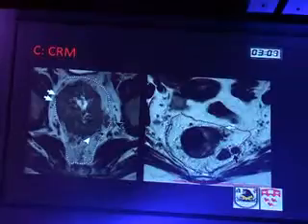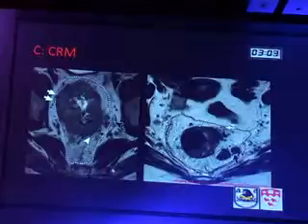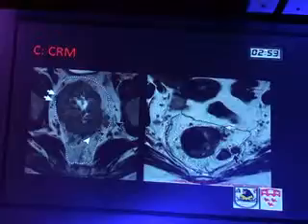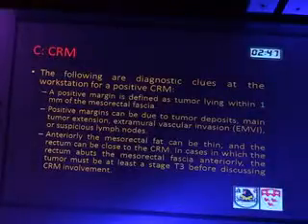Again, another example, a large tumor circumferential around the rectum with involvement by the tumor as well as the lymph nodes. The last example, and a very important example here, is where's the arrow here? This is involvement of the extramural vascular invasion of the vessels by the tumor as well as the lymph nodes. Both of them are involved, violating the mesorectal fascia and causing the tumor to be CRM positive. And the tumor itself is away from the mesorectal fascia.